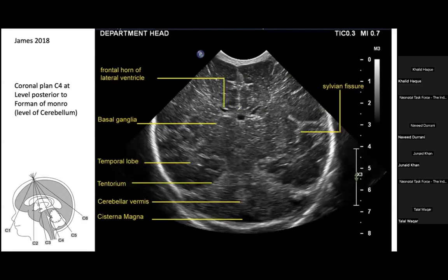C4 structures, if you see here, this is also called a Christmas tree. And if you just see the arrows pointing, this is the base of the Christmas tree. And these are like the green part of the Christmas tree.